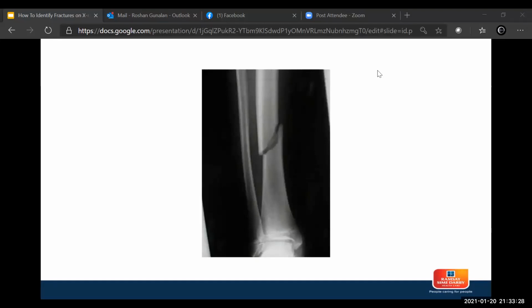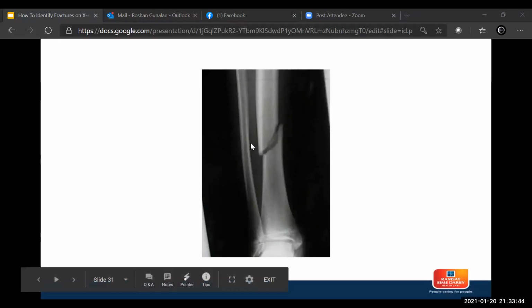Balki said spiral distal third tibia fracture. Okay, very good. Now some more, spiral fracture, lower third, excellent. Yes, plastic. Okay, someone is getting very close. W, you're very, very good. You said there's a plastic deformation of the right fibula. There's a slight bend in the fibula, which is very, very good that you picked it up. Wow. Okay, so whoever W is, well done.